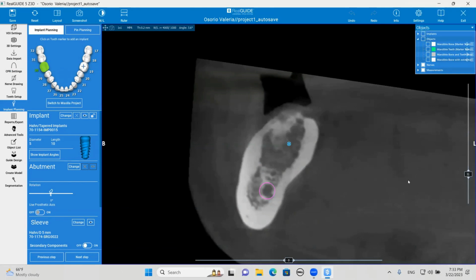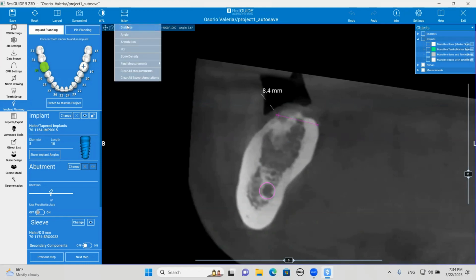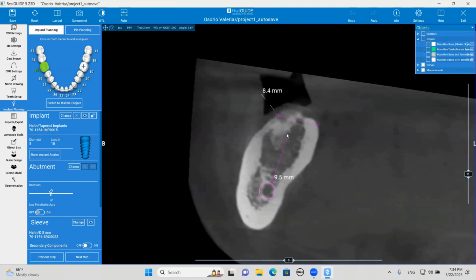Okay, Jimmy, did you say you used an osteogen plug? Yes. Okay, so you do have the buccal plate still. The strange thing here is that the trabeculae, the marrow space, has very poor bone density. That's rather significant. So how old is this patient? 29. Wow.